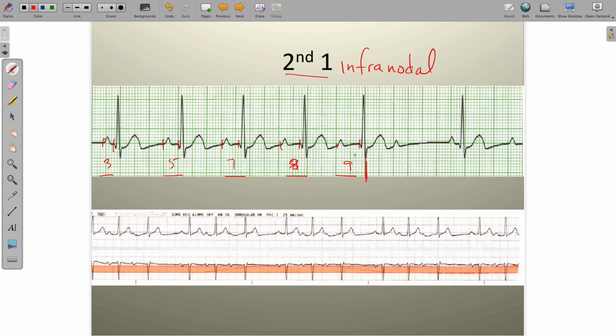So now let's look at what happens after this red line. We have a P wave that shows up, yet there's no QRS complex following. So essentially what's happened here is the heart has decided, hey, the PR interval's gotten so long, we need to reset that. So we're going to reset that area just before the AV node.